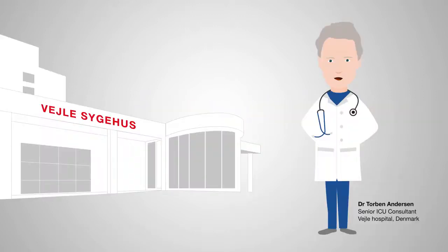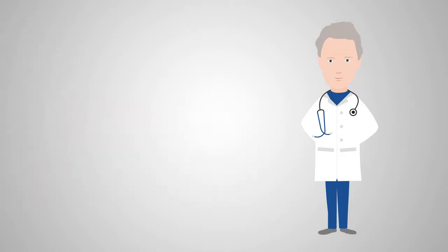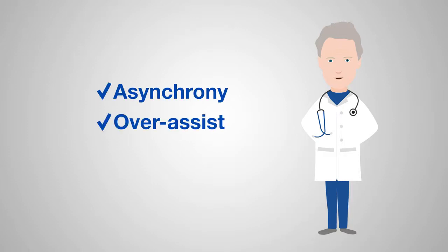Hi, I am Dr. Andersen, and I will show you how using personalized ventilation as a routine in my ICU helps me manage common problems with ventilation, such as asynchrony, over-assist, and over-sedation. Personalized ventilation helps me reduce ventilator days, sedation needs, and ventilator-induced complications in my patients.